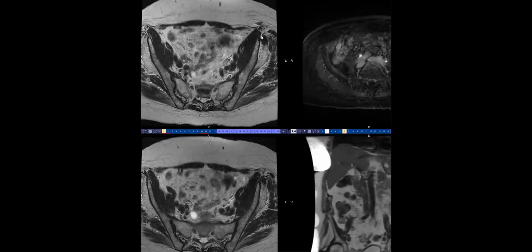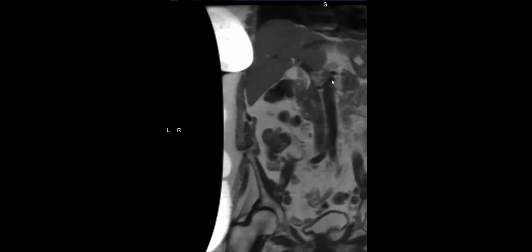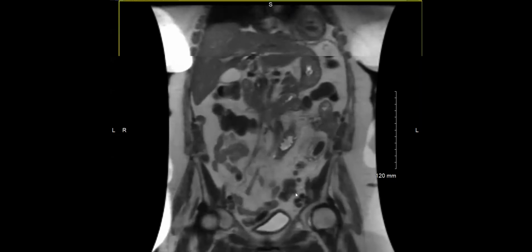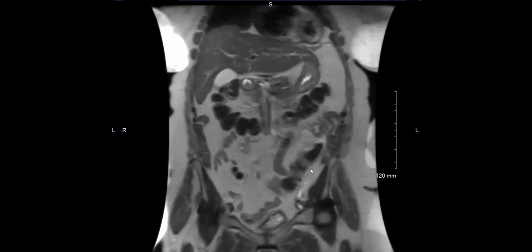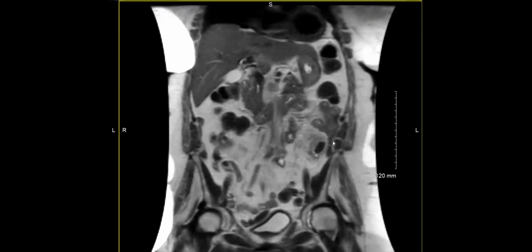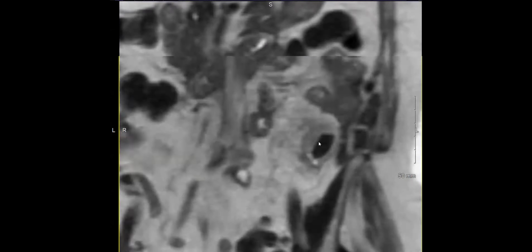All right. So the first two cases, let me show them side by side because they come in two kind of situations. So this is a urogram that we were reading outpatient, and you can see something here caught my eye. See that? The wall here looks a little thickened, and the fat looks kind of dirty too.